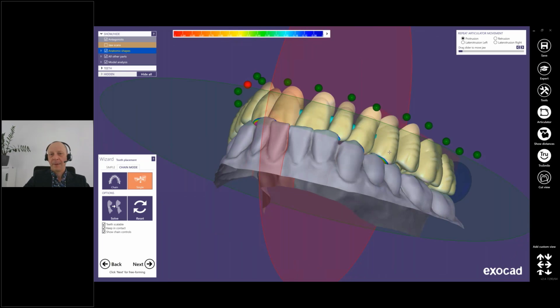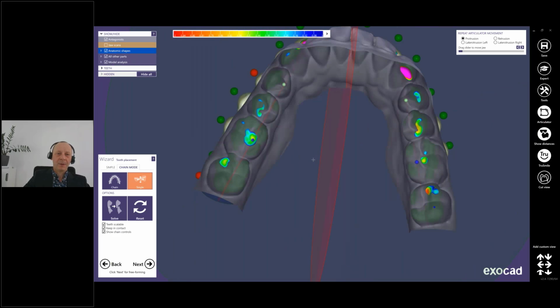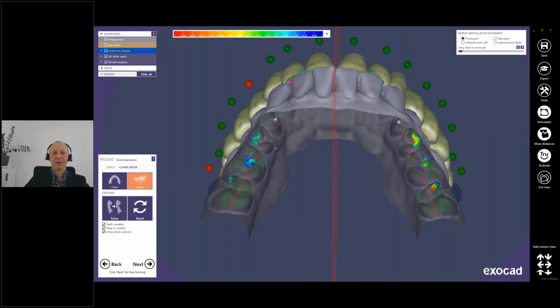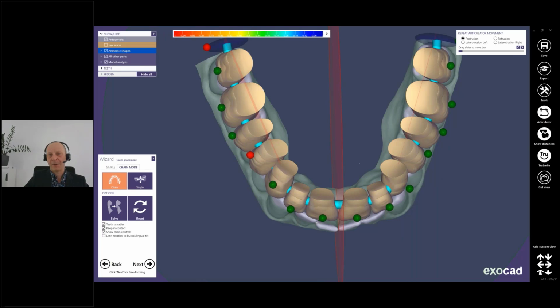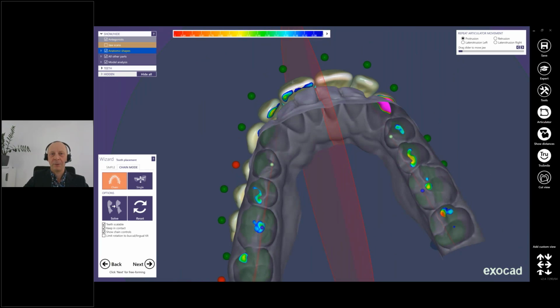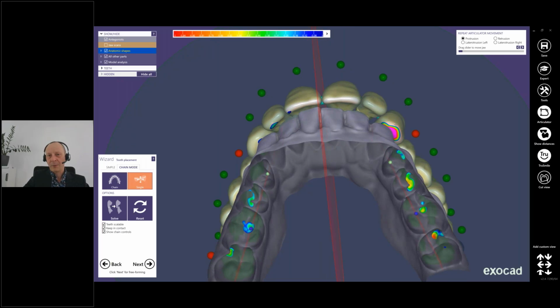Some adjustments. Okay. Maybe I keep contact of my sixth in static occlusion, and I will create a guidance for dynamic occlusion. Back in chain mode, I fix premolars, and now I can adjust the anterior group like this. You see, they are scalable. It's good in single mode.